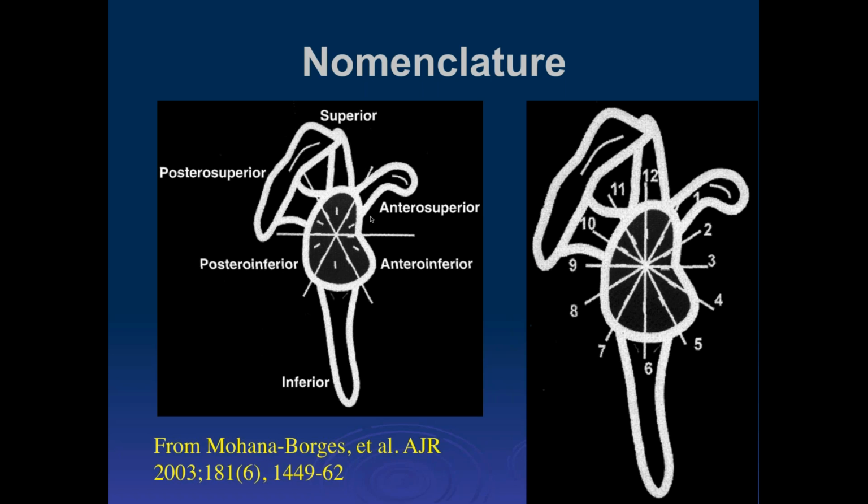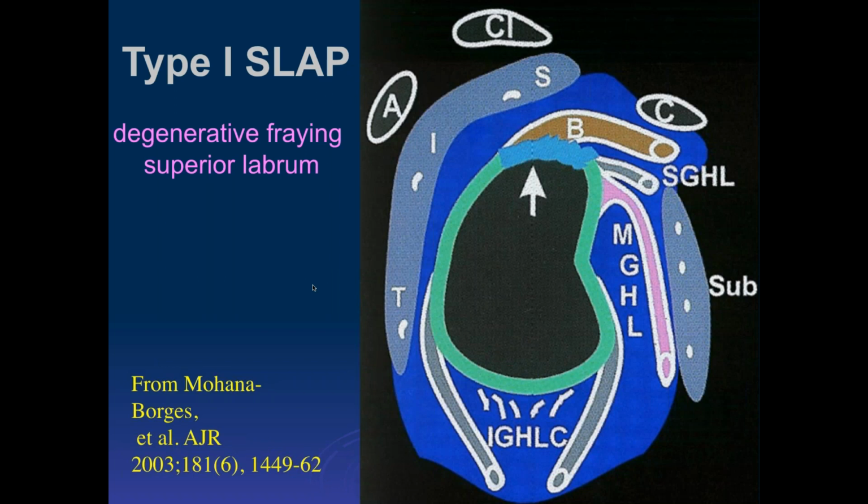But classically, you should describe the locations around the glenoid with the biceps insertion at the 0 position, or the 12 o'clock position, and then you go around it there. And you can either use anterior superior, anterior inferior, or an o'clock position. We're not really all that accurate, especially in correlation with surgical findings. So I think people who use the clock position really have an inflated sense of their accuracy. If you use one, I prefer this one: superior, inferior, anterior superior, anterior inferior as locations.